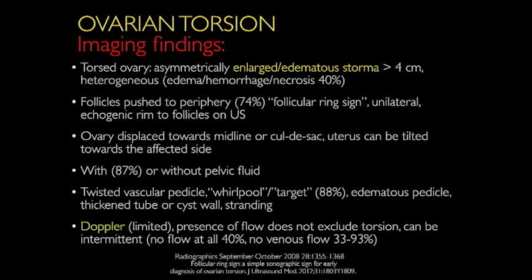There's often free fluid. And one of the very useful signs, which in the past we didn't really feel we could see that well on the ultrasound, but I have to say that about 80 to 90% of the time nowadays we see the twisted vascular pedicle sign. In the older literature it was described as better seen on cross-sectional imaging, but perhaps it's one of those things that one of my great mentors said, that you only diagnose what you know or what you're looking for.